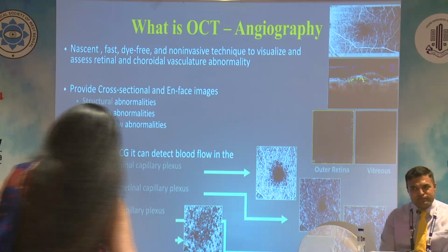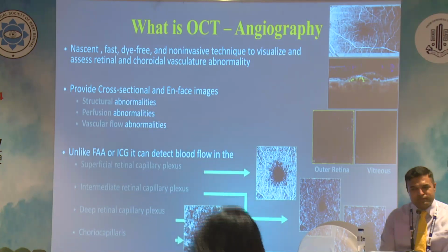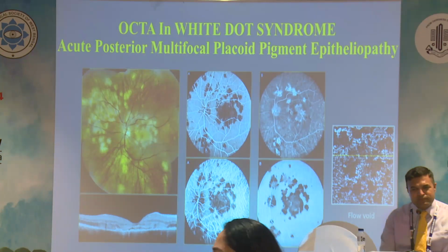So the details, how does it work, has already been discussed beautifully by Dr. Devesh. I will skip that. So now I come to OCTA and white dot syndrome.